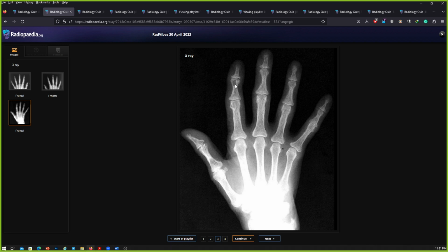You described it well. Your description is good. So whenever there's a bony lesion, describe the lesion properly. You can either go from the center and then peripherally, whether it's well defined or not, whether it reaches the joint or not, if it has a narrow or a wide zone of transition, associated soft tissue tumor or swelling or not, whether it causes any cortical disruption or breakage, and then you have to speak about the matrix also.